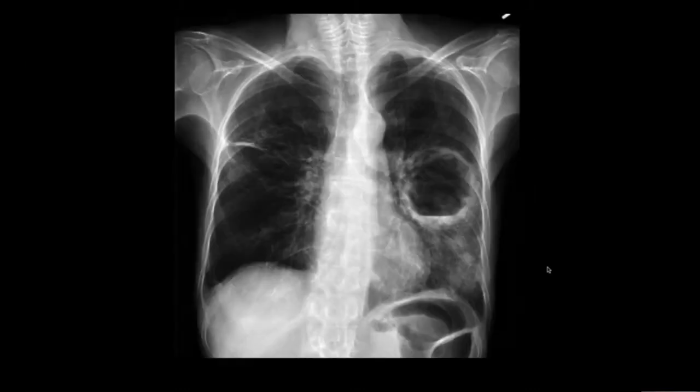This is another example of a lung cavitation. Again, this was secondary to lung abscess. You can see a very nice lucent lesion located in the left mid zone. It has an irregular wall, and if you look at the most inferior part, you can see a gas fluid level. Again, there is surrounding consolidation, particularly in the left lower zone. There's also an additional finding of small plate atelectasis in the right lung.